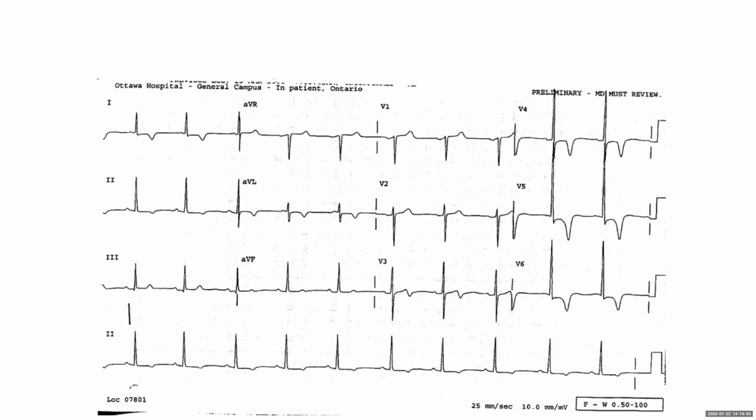Excellent. Any questions about this ECG? So in real life now, this is probably hypertrophic cardiomyopathy. What type of hypertrophic cardiomyopathy? Apical. Yeah, good for you. This is classic apical hypertrophic cardiomyopathy. Abdulaziz, you're mentioning wrong placement. Why do you think there's wrong placement?